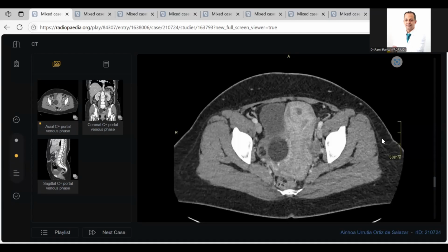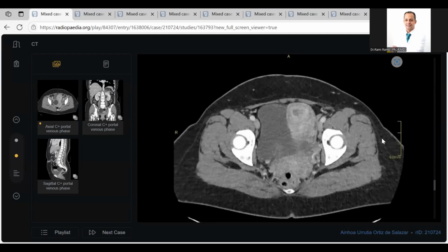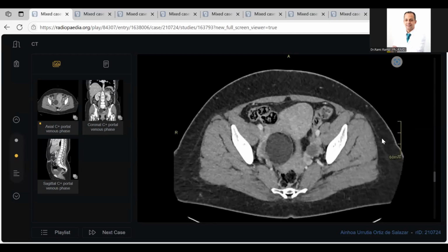Most welcome, doctor. My colleagues, this is another example of a typical FRCR exam case. Very easy, very typical. You shouldn't face only miserable cases. More than 50, 60% are typical cases. The examiner wanted to listen from you the basics of radiology only. The remaining may be more difficult, harder. But at least this is an example of a very typical, very easy case.